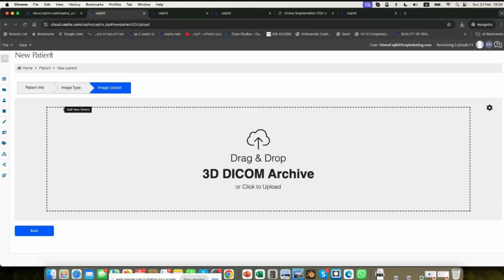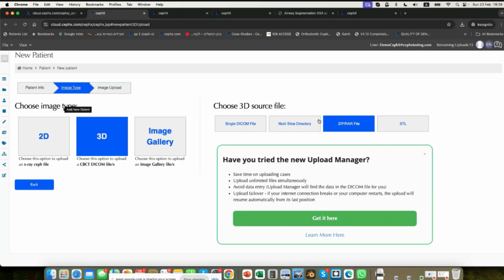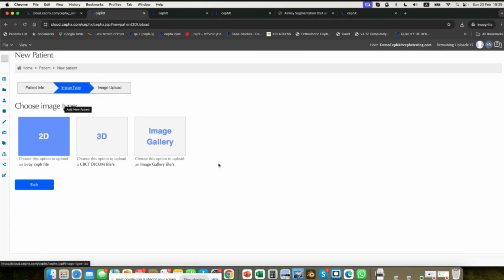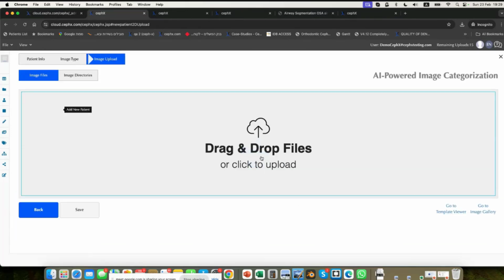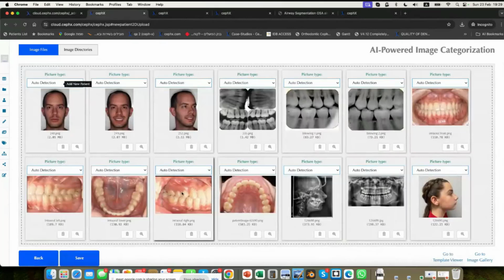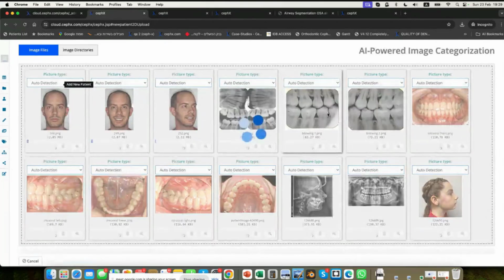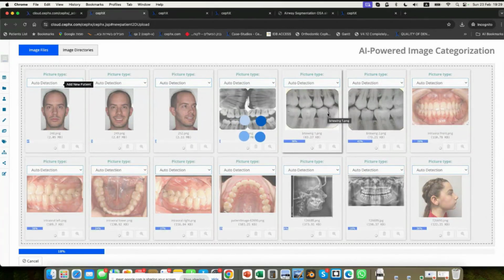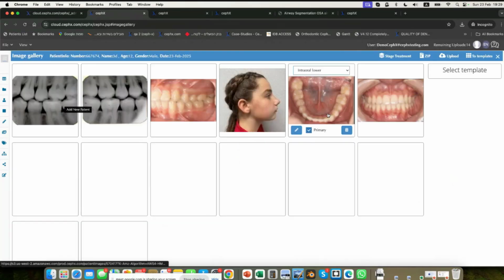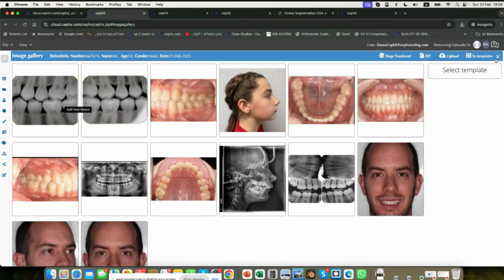I think it's kind of in the live demo. So let's go to the image gallery. This is a live demo, right? This is happening on the fly. So once you select your images and once they're uploaded, they're uploading now. It'll probably be faster from your location. But once they've finished uploading, it's pretty much done. So your gallery is already done.